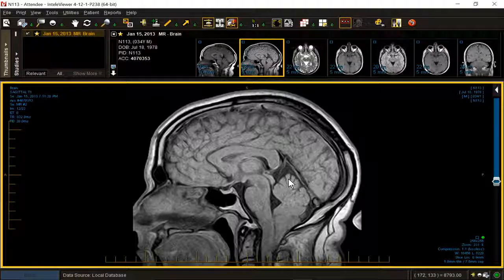Why is it a Chiari 1? Well, I did not give you a history of a myelomeningocele, which all Chiari 2s have. The patient has occipital headaches only. There is no cervical medullary kinking. There is no Z deformity of the craniocervical junction, something that might look like this.